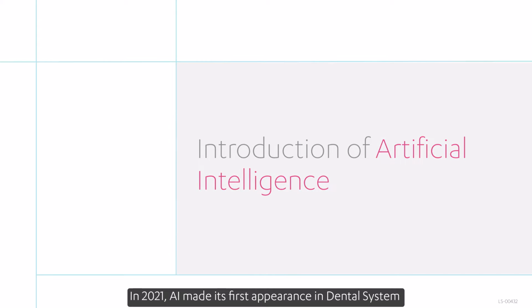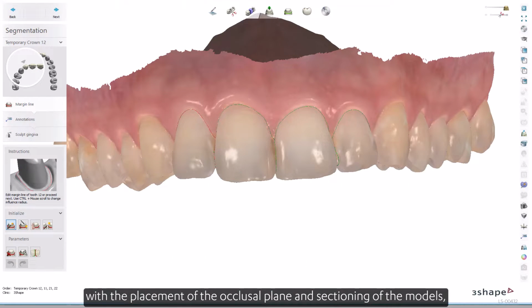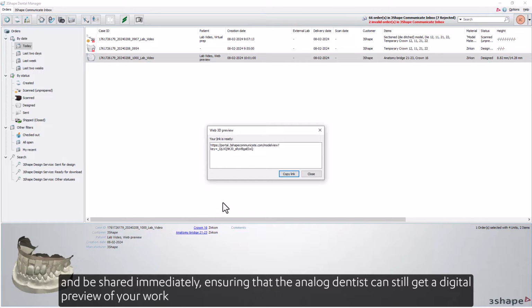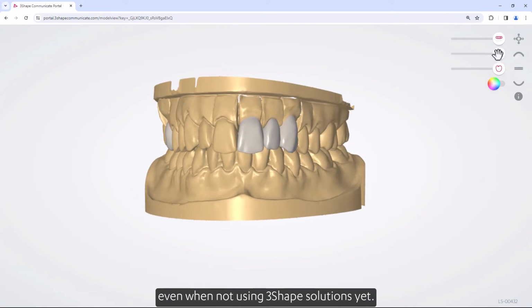In 2021, AI made its first appearance in Dental System with the placement of the occlusal plane and sectioning of the models, which helped to automate and streamline the design process. We also introduced the 3D Web Preview, meaning that any case in Dental System can be used to generate a link and be shared immediately, ensuring that the analog dentist can still get a digital preview of your work, even when not using 3Shape solutions yet.